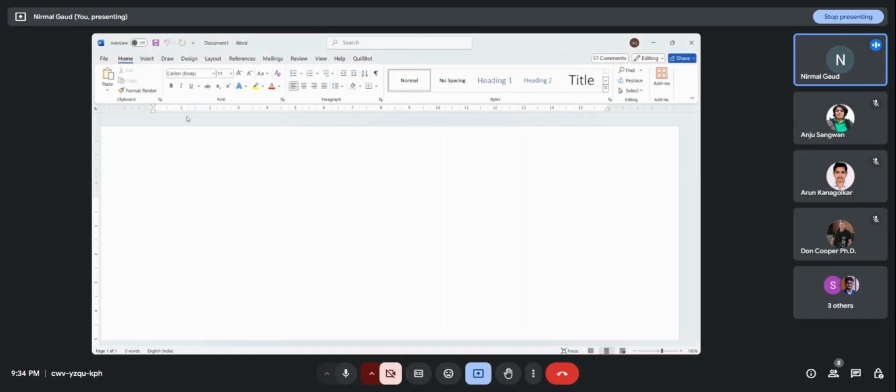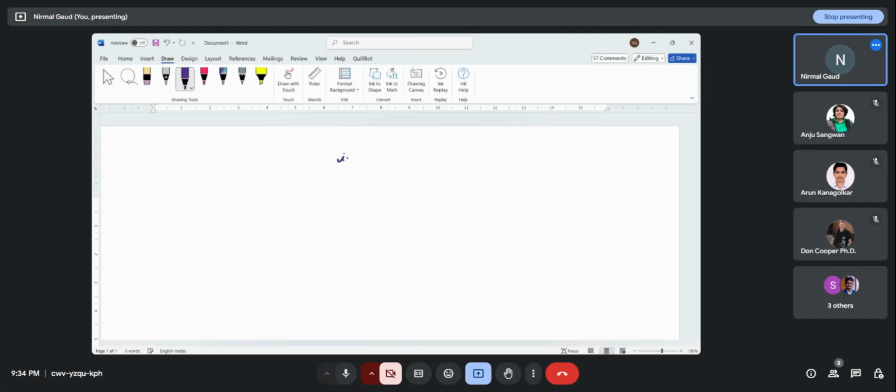So you are initially available with images. Images you are having in two folders. One is the fracture folder where fracture images are kept. Another is the non-fracture folder where non-fracture images were kept. Okay, this is what you are having. The images we have seen are grayscale images because these are X-ray images. So X-ray images are grayscale images only. Fine.